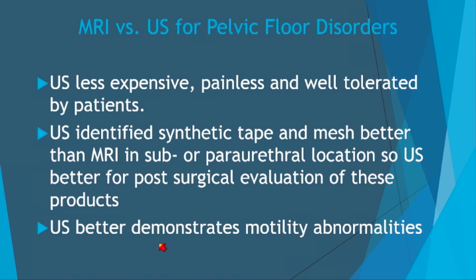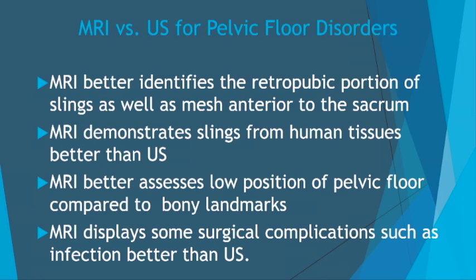Furthermore, ultrasound is better in identifying movement. So if you have some kind of dysmotility, as I've shown you in the slides, it's an excellent way to show that in real time. But MR definitely has a place in pelvic floor disorders, and what we found in our experience is these are the areas that we particularly like to do MR.